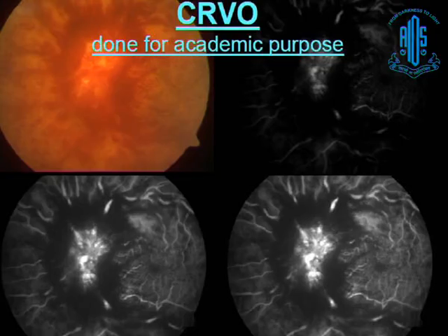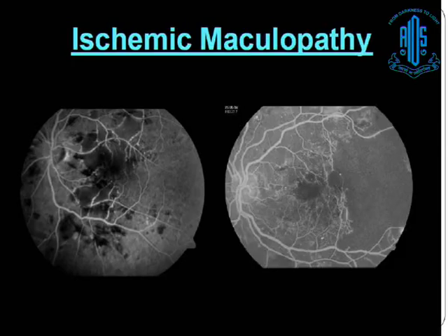In CRVO, in the acute phases, it is done mainly for academic purposes. In acute phases, it is usually not done because all the information will be hidden by the severe retinal hemorrhages. But in ischemic maculopathy, it is very important because the prognosis depends on the angiography, as we can see the phase is entirely distorted. So the visual prognosis is guarded in these cases, and there are controversies whether anti-VEGF should be used in ischemic maculopathy or not.